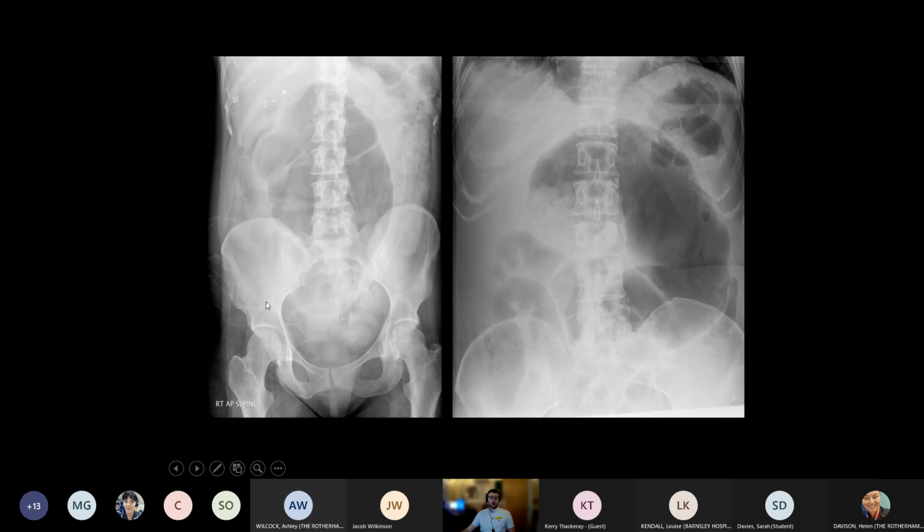Two examples. So it's twisted here, and this is a dilated cecum that has come upwards. You can see it's still got the folds here. And in this example, again, we've started here. The cecum is twisted. It's actually gone up and round here. Again, we know it's cecum because it's still got these folds preserved here. Again, the patient will go on to have CT imaging, and they'll be able to see what's going on.